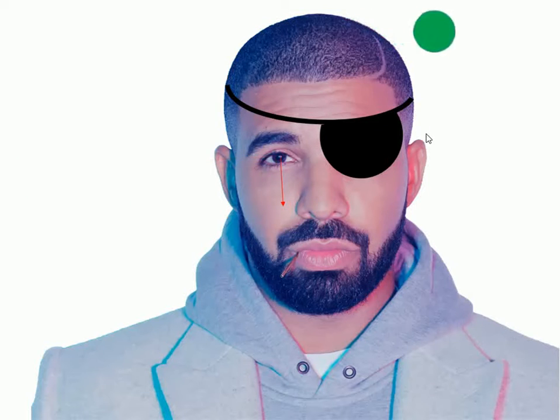Now, if the ball comes from the other side, it's picked up a little bit later. Here we have about 60 degrees of visual field. So we can't pick it up when it comes directly to our left side from our right eye. This might be, for example, because our nose, the nasal bridge, is blocking our view.